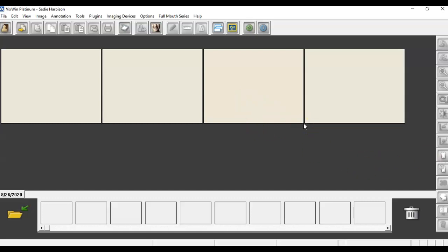It's just not nearly as time efficient as you take your film, drag it up, optimize your film. The doctors have to have you do this for clarity, otherwise the images are more grainy. So you'll hear a lot of complaining if you don't do it, because it really is an extra step that they'd have to do, and you're right there in the mode. So take your picture, drag it up, optimize.